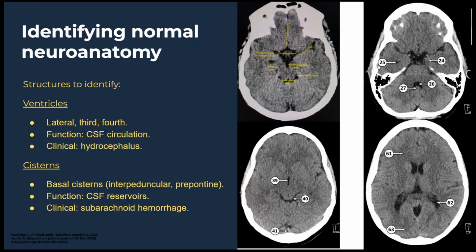And then just the last one, the fourth ventricle. Is it either 25, 26, 27, or 24? Yeah, that one's 26. That's good.